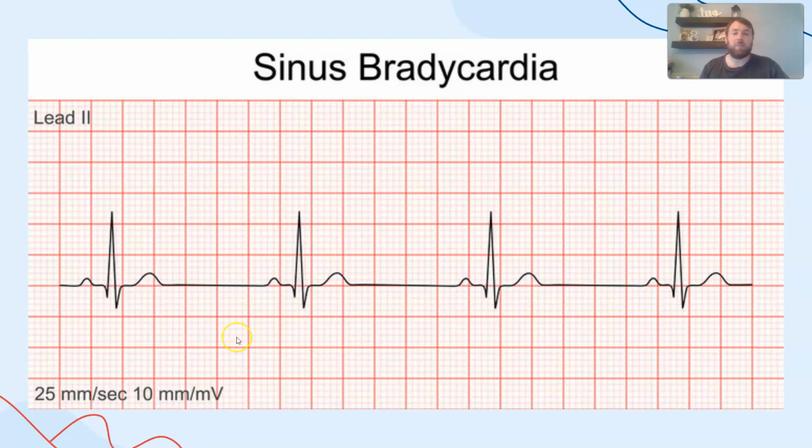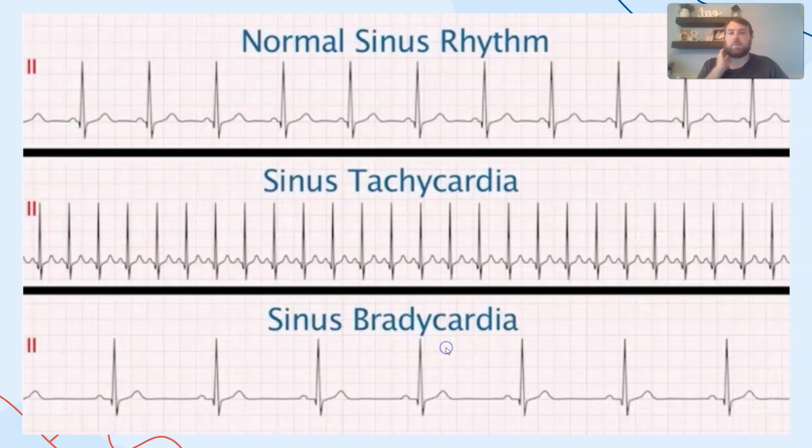That is a long time between heartbeats. This individual is having their heart beat too slowly. It does not matter that this heart rhythm is consistent over the same spacing. It is too slow, too infrequent. Their heart is not working strongly enough, and so we are calling this bradycardia.